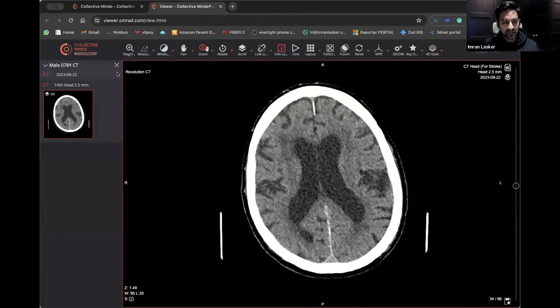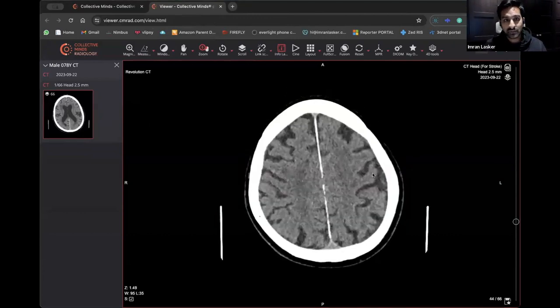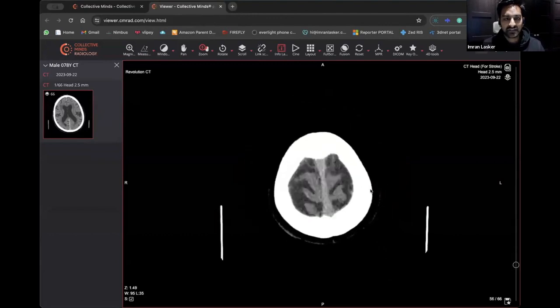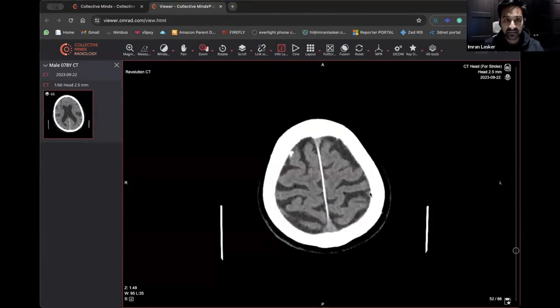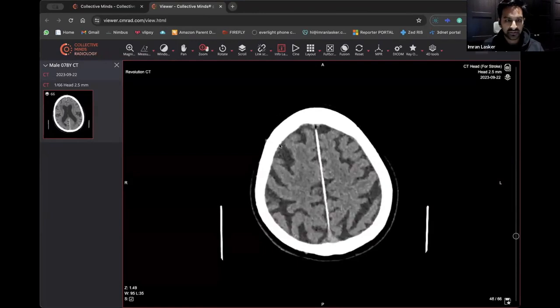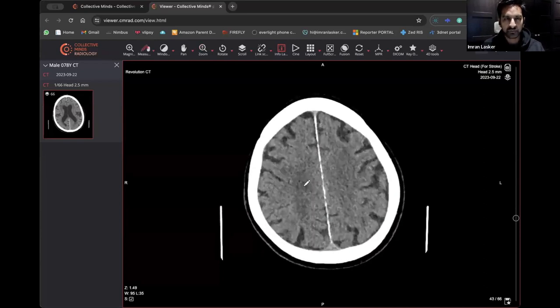We're going to gear it towards most people's ability, because we have a fair few people who are just interested, and some people actually do this day in and day out, right? So first off, let's go from the very top. This is an axial CT scan of a patient's head, right from the top to the bottom. Scrolling through, when you look at these crevice areas, you can see these CSF spaces, they look kind of large. So they must be older, all right? They're not going to be a young patient.